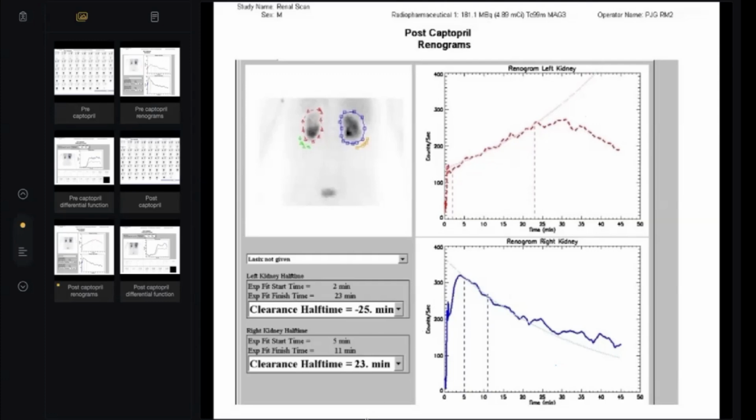Despite there being an answer for your question, let us concentrate on our target. This question has an answer, by the way. The normal kidney may be a little bit affected, but look here and look here, which one is maximally affected? The diseased one. For more details, my advice is to look into it after finishing the FRCR exam. This is for our benefit.